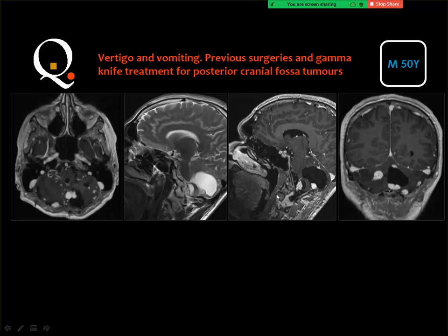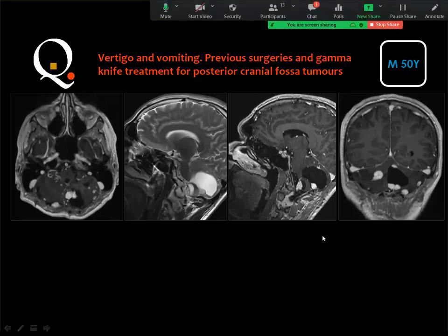And whenever you see a lesion that is similar to pilocytic astrocytoma in adults, you confirm your diagnosis by multiplicity, since the pilocytic astrocytoma is not multiple, but the hemangioblastoma can be multiple in the posterior fossa as well as in the spinal cord. Then whenever you see these lesions, your diagnosis is hemangioblastoma, and because they are multiple, you consider the possibility of von Hippel-Lindau syndrome.